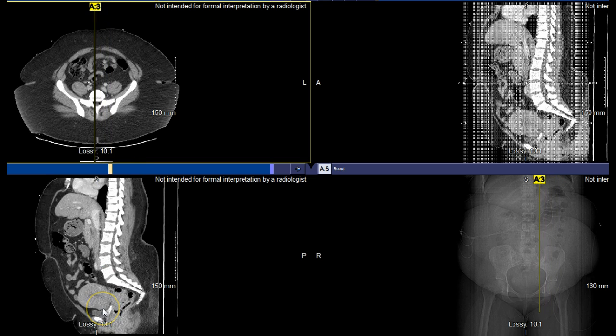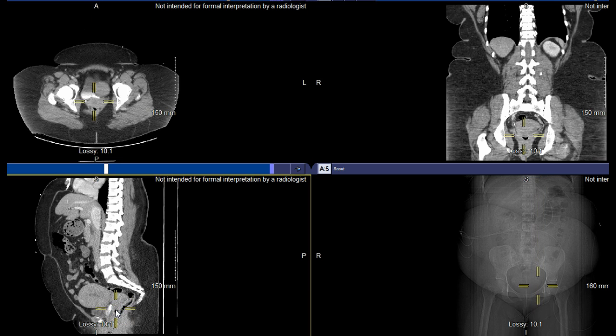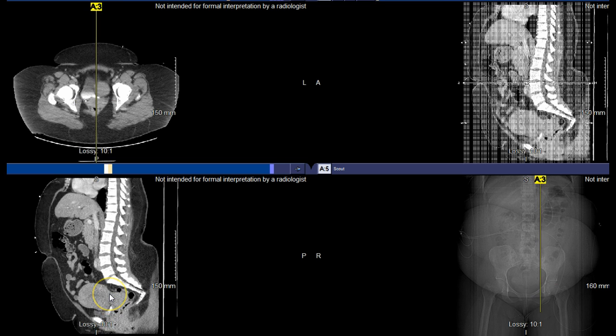And when we look at this patient, what you can see here is the area of the rectum itself, and up here it'll be transitioning to sigmoid colon. You can see this whole contour now of this patient's uterus. That's very visible there, and you can see the structure of the bladder, where that's located. You can see the region of the cervix, and then as we would continue to transition down, we would, of course, get into the vagina as we move more inferior for this particular patient.